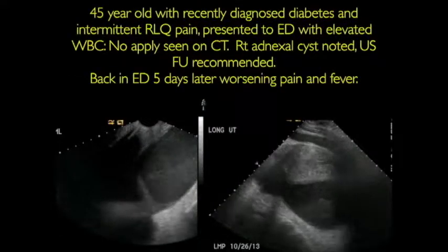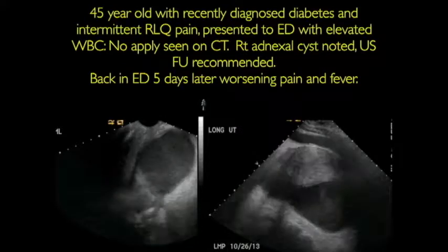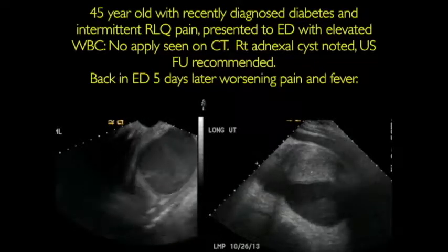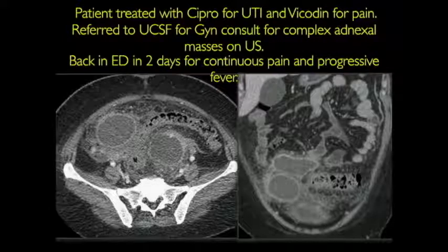So the patient had a follow-up ultrasound. It looked kind of funky. They weren't sure what it was. And they said, well, let's send it to UCSF for a GYN consult. There was a delay in getting the appointment and so forth. So the patient, again, came back to the emergency room. And now we got another repeat CT, and you could see that there is really rip-roaring infection. Now it's involving the adjacent bowel and everything.